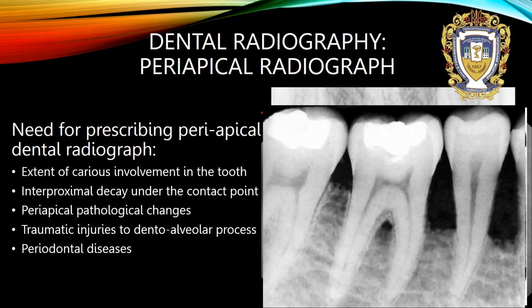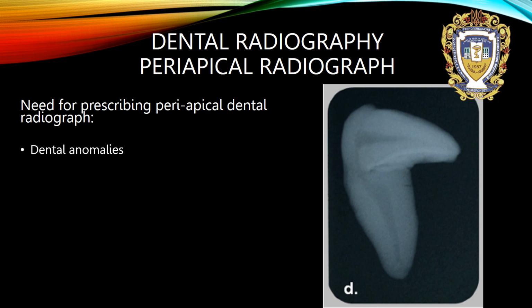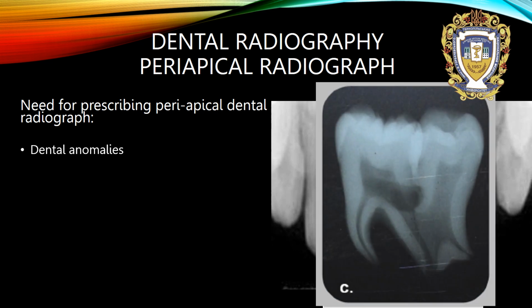As you can see, a low level of bone and resorption. Next indications, dental anomalies, like this, ingrown teeth, or here, a double tooth, or here, two ingrown teeth.